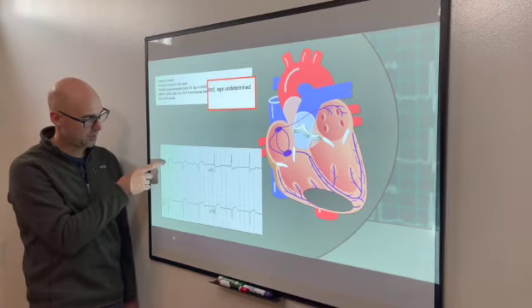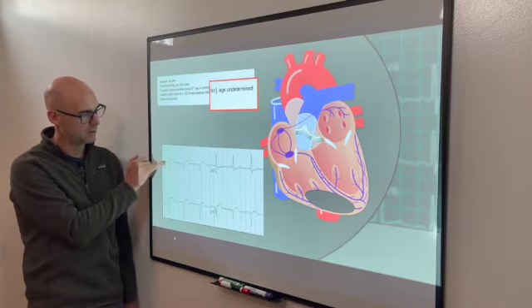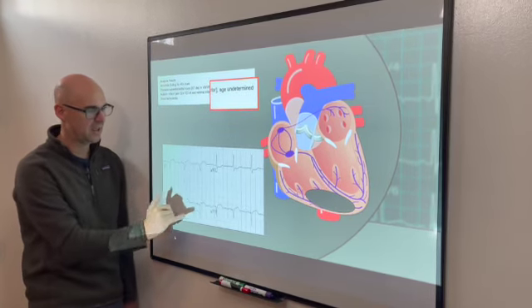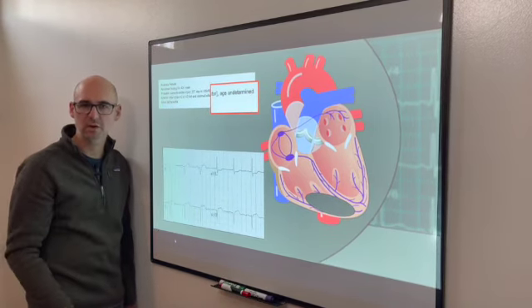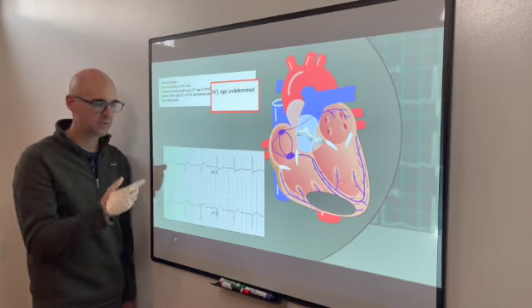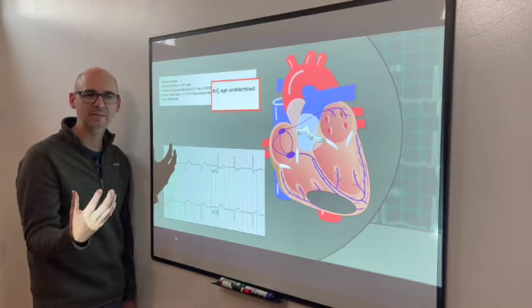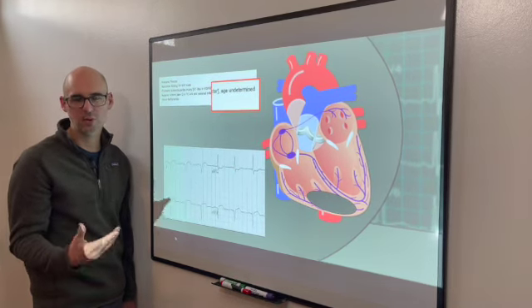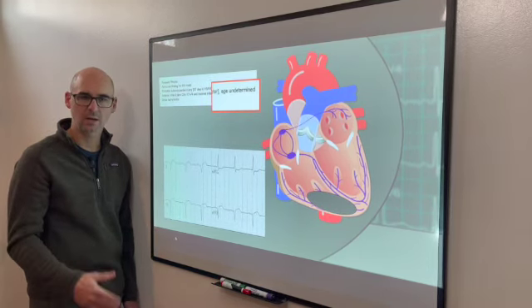And we can see even on this little snippet of a 12 lead, in the inferior leads here, we have these large, wide Q waves in 2, 3, and AVF, representing an inferior infarction that has more or less completely run its course. Sometimes cardiologists will refer to patients as being Q'd out, meaning that there are these large Q waves throughout the area of the infarction. What that means is that that part of the heart is already fully infarcted, and that intervention at that point in time is not going to be of much use. These patients are going to be managed medically, typically.